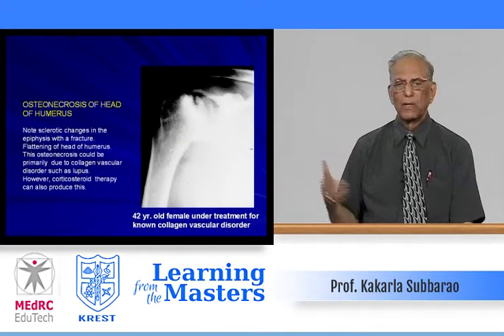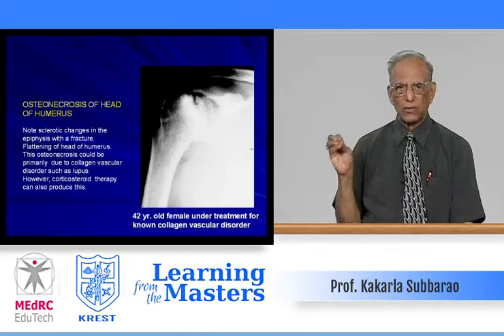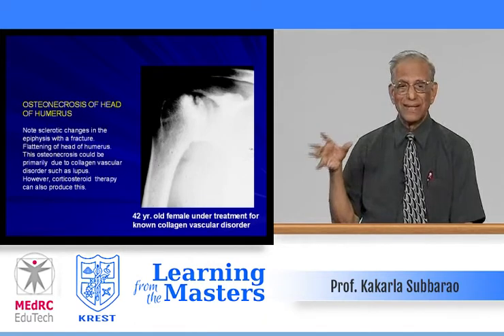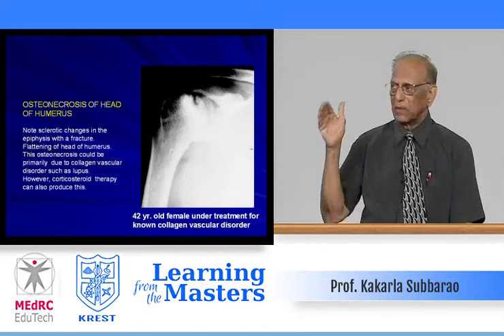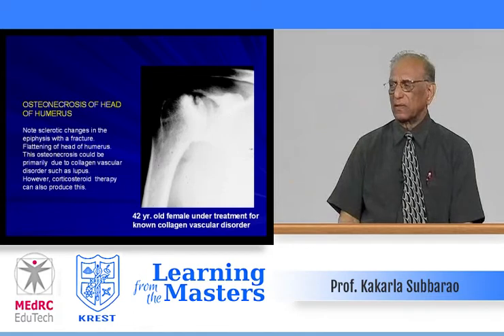This again a spot diagnosis, osteonecrosis of head of humerus. Wherever the osteonecrosis is seen, say metacarpal heads, rare but not unusual, and then hips, very common, you find this dense reactive sclerosis because of the ischemia and a fracture line. Not a complete fracture, but a radiolucent incomplete fracture. Sclerotic changes in the epiphysis, the fracture.